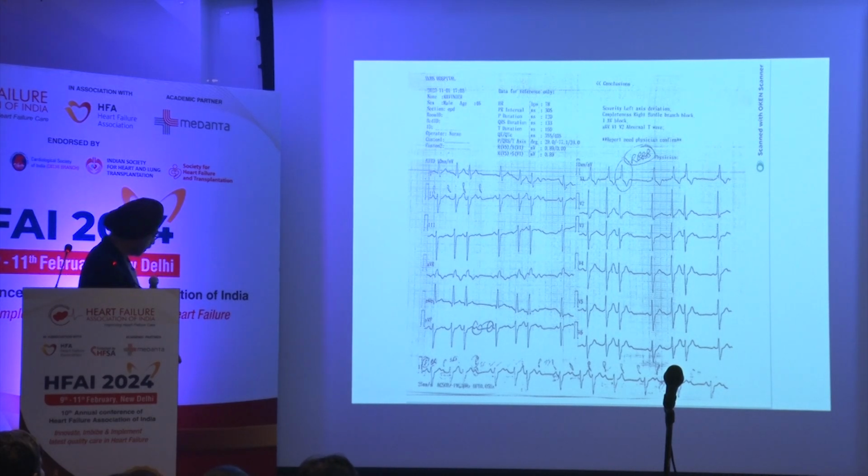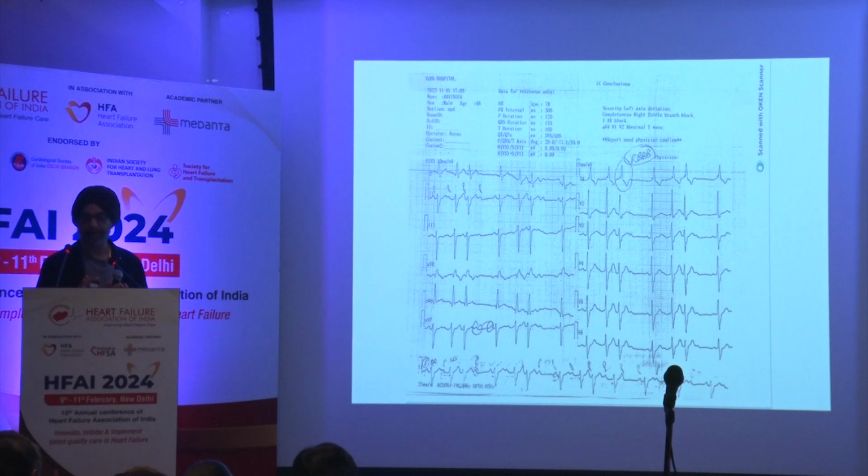So this is the only odd beat which in my opinion was a supernormal conduction. And this can happen. Supernormal conduction happens when you had a prolonged PR, so there is some time for the recovery of the bundles. So supernormal conduction happened here and then it blocked off. So this patient has a high likelihood of getting into trouble, should be immediately admitted and thought about what's happening.